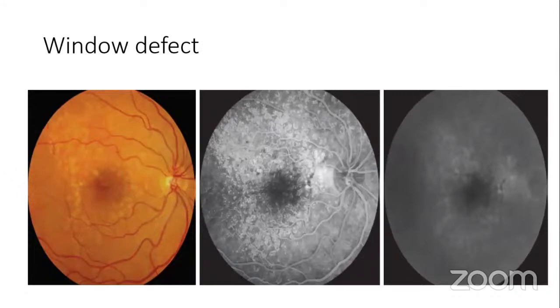So this person has geographic atrophy. It has RPE atrophy with the drusen. Remember the location of the drusen. It's within the RPE basal laminar layer. They are around the same region. So the atrophy makes the patchy hyperfluorescence from the choroid visible based on window defect. And then the drusen themselves, they stain. So when you look at this film, the first thing you should be looking at is what is the time. There's no timing given on this film, so we'll look at the vessels.